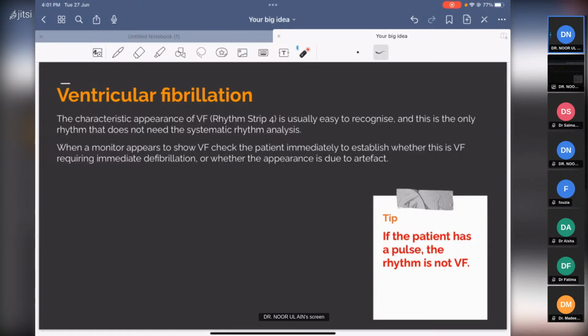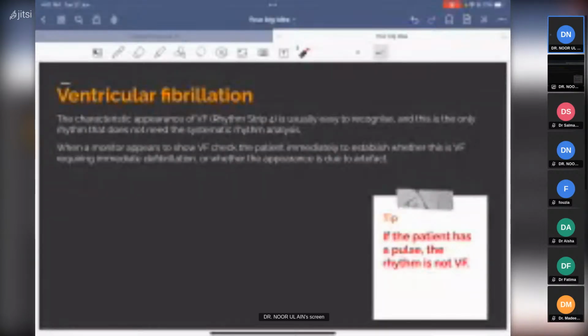इसीलिए we want to identify ventricular fibrillation as soon as we can, because we catch it and just that's it, we go ahead and we just shock it. And this is the easiest to identify. देखते पता चल जाता है, तो आपको ये जो 6 क्वेश्चन हैं ये पूछने की भी जरूरत नहीं है खुद से. You know this is VF.